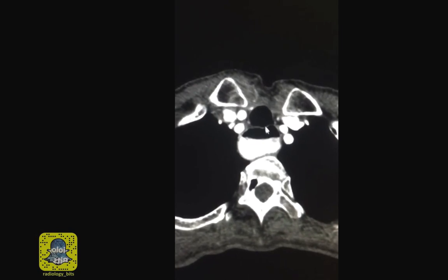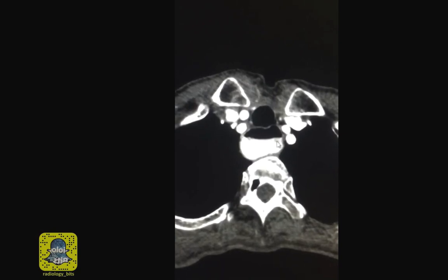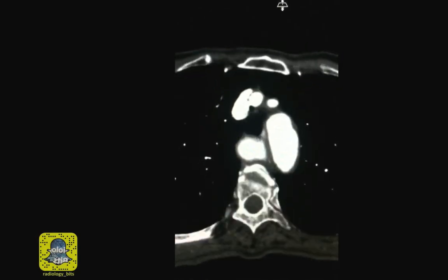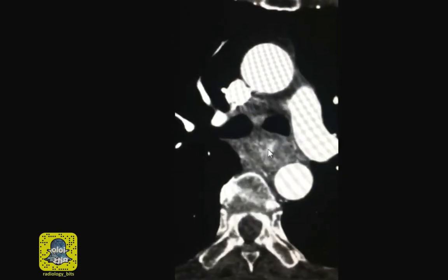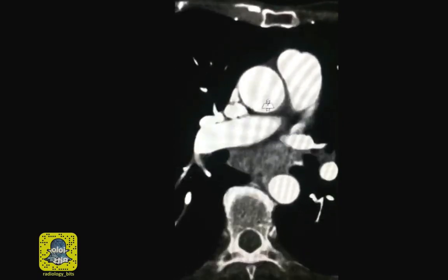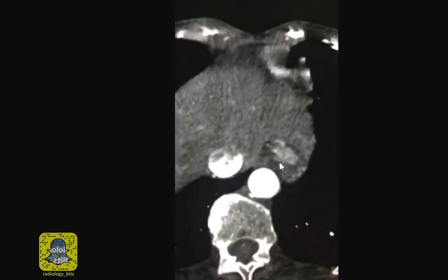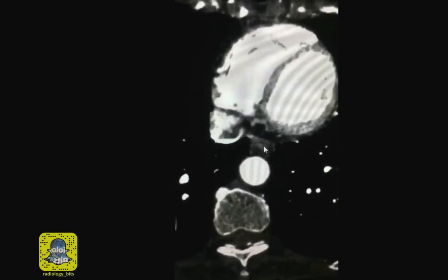This is the axial CT on the same patient showing the trachea anteriorly and the dilated esophagus posteriorly with an air contrast level. So an air contrast level because we gave the patient oral contrast, and notice how the esophagus is dilated all the way till you reach here. You start to lose the lumen. So this is the narrowed lumen, and this entire soft tissue density is a very thickened esophagus. As you go lower down, the abnormality obliterates the lumen. And the more distal esophagus, reaching to the stomach here, distal to the lesion, is actually collapsed.